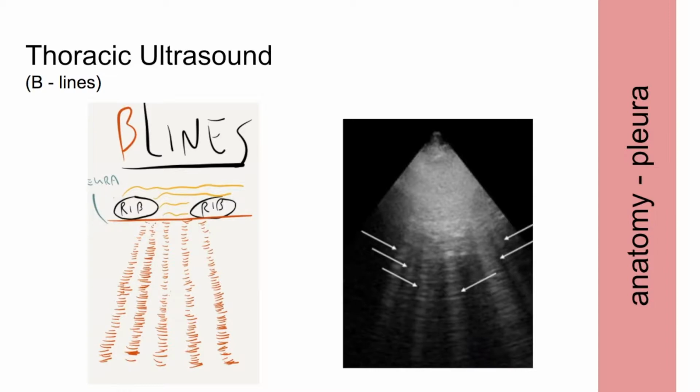Acute respiratory distress syndrome and pulmonary fibrosis tend to give rise to more patchy involvement and spared areas, and a non-homogeneous distribution of B-lines, as well as an irregular, thickened or fragmented pleural line.